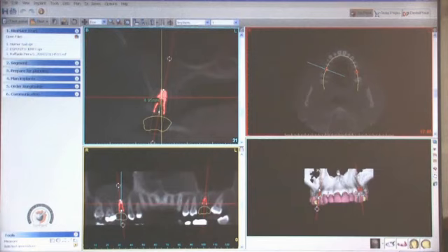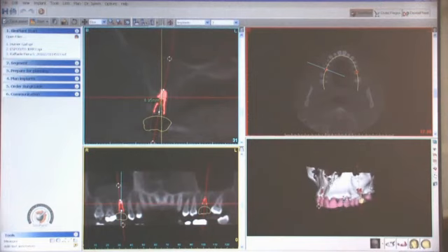Okay, so just to walk around the horn here, on the bottom right, you can see a three-dimensional rendering of the case. It's obviously a maxillary case, and looking at replacing maxillary first molars bilaterally. And then, so what we have done is segmented the case, and you can see that, and we'll go ahead and blow that view up.